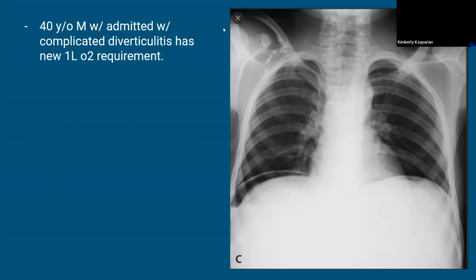Sorry, I might have just given the answer away. Airway is midline. Nothing stands out from a bone standpoint, cardiac silhouette looks fine. On the diaphragm, it looks like there's intra-abdominal air that you can see on the right side. And then the lungs look pretty clear. So that would be a sign of a perf in this patient. Absolutely. So you're spot on with everything. That's what it was.